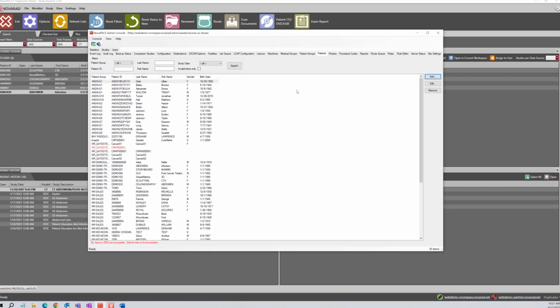Now, the next tab we're going to talk about is the studies tab. There is a restore. So we could find everything that has been removed recently, within the last month or two. We can undo. So moving on to the studies tab.